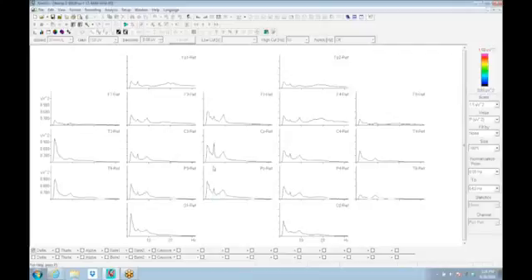Here you can see the narrow peak. You can see the detail of some of these little tiny pieces, the multiple steps within the alpha peak here in the parietal area.